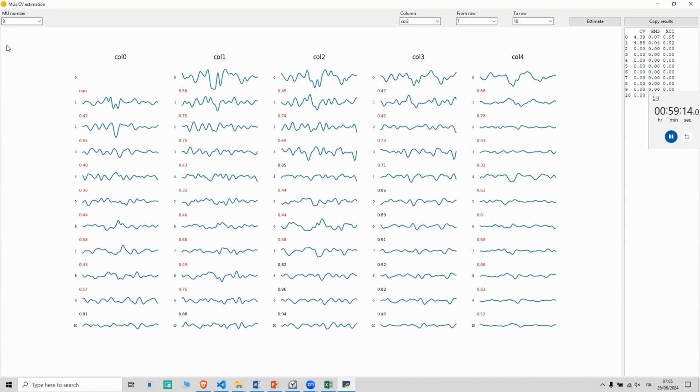I would not look for any channel in order to calculate conduction velocity. This is simply too noisy, and it might bias the final estimate. Good example, so-and-so, and wrong example.